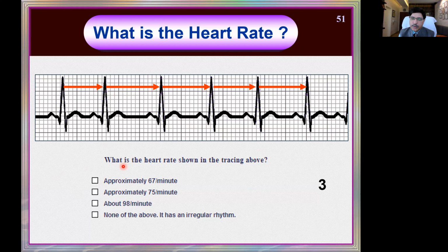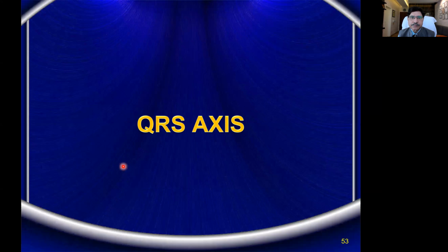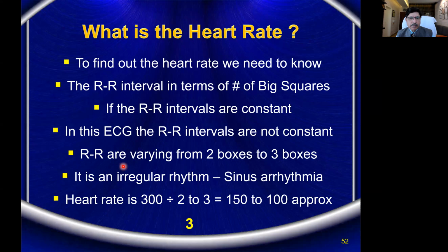Now, all of you, I'll show you one ECG. You tell me the rate. Okay, I'll give you the exercise at the end.